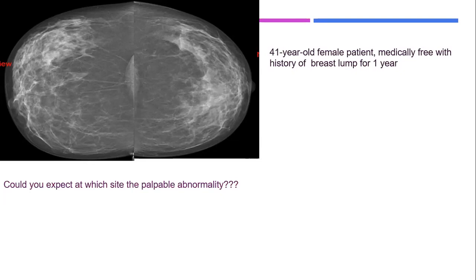First of all, what is the ACR density of this breast? The breast density, C. ACR C. Okay, this is C, excellent. But C toward D or C toward B? Toward D. Is it extremely dense? No, not in some areas. No, but it is heterogeneously dense, toward B. Yes, there is a lot of fat, it's toward B.